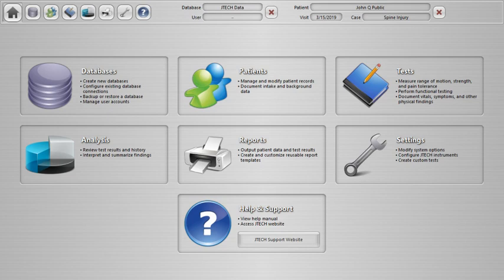For those of you who might be watching this who are not familiar with JTech's previous products, that's okay. We're going to be going through essentially a typical session of using the software and making sure that everybody feels comfortable with the general navigation and use as well. And as we go, we're going to be hitting some of those high points and making sure that you have a pretty good idea of what we've been working on and why Northstar would be a good fit for you.